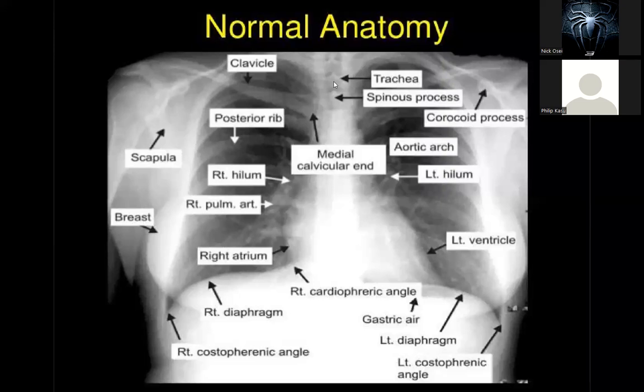So things to note are that when it is white, we say it is radio opaque. When it is dark, we say it is radiolucent. Okay. So there's some radiolucency within all this opacification here. So that is what we see over here, and that is the trachea running through. And if you look critically, you see that the spinous processes are shown here. So this is one spinous process.